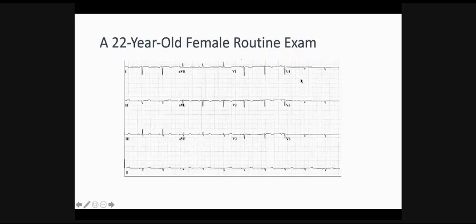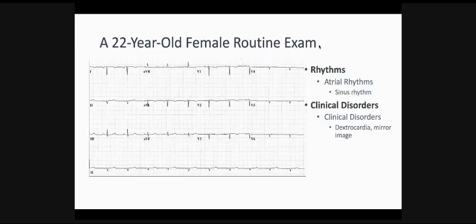So this is not a surprise for everyone. Just be careful coding this as a limb lead reversal. This is a sinus rhythm, and this is a dextrocardia.